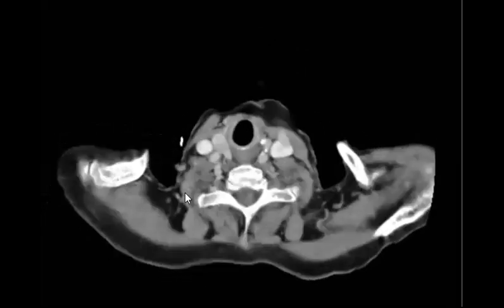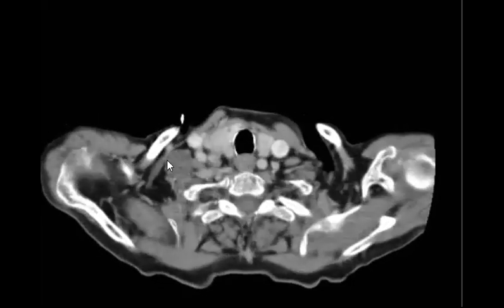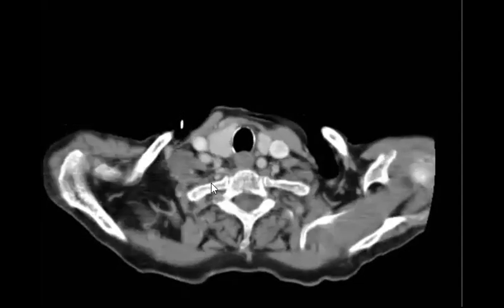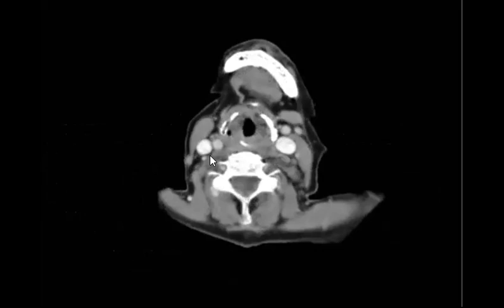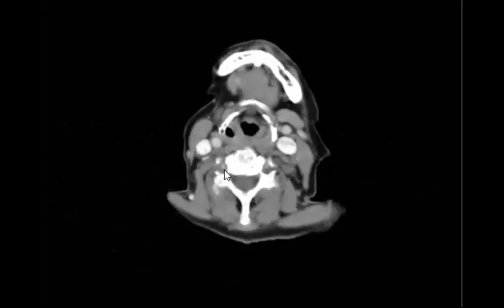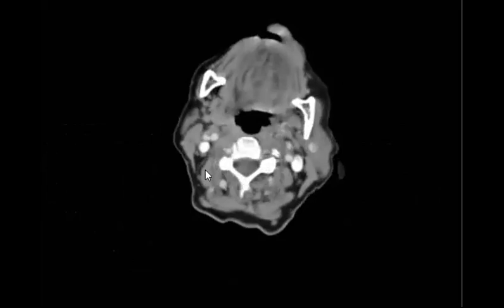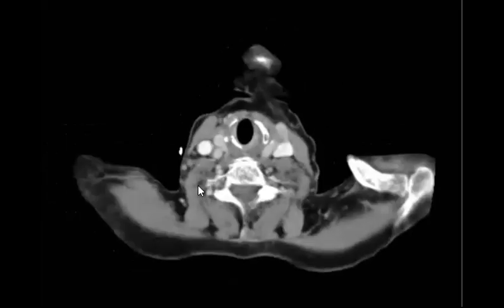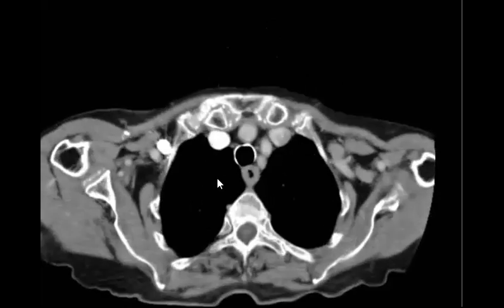Yes, it can be lymphadenopathy, or a nerve sheath tumor because it is in the neurovascular bundle, or a neurogenic tumor. You can see there is some extension through the foramina, going with the entrance of the transverse foramen. It can be a soft tissue tumor like liposarcoma, maybe, why not?